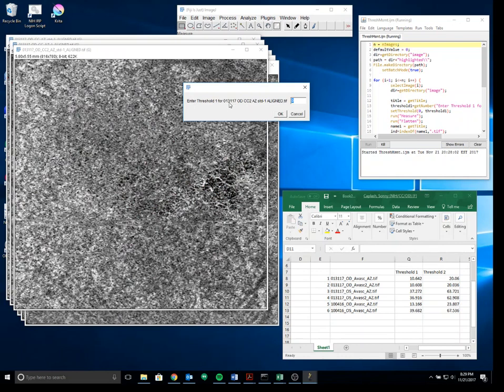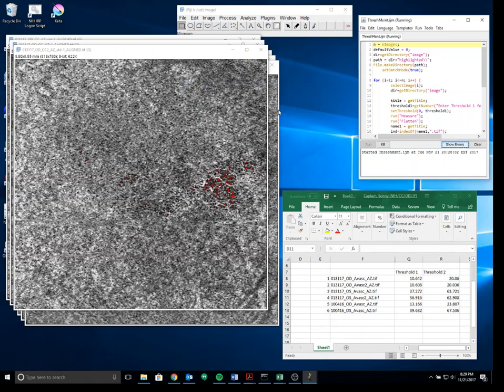Okay, now we're on to 131 choriocapillaris 2. So to remind you, we're at avascular 2. Because this is the second picture of the right eye, and so we want to get to the same parallel second picture of the avascular zone.